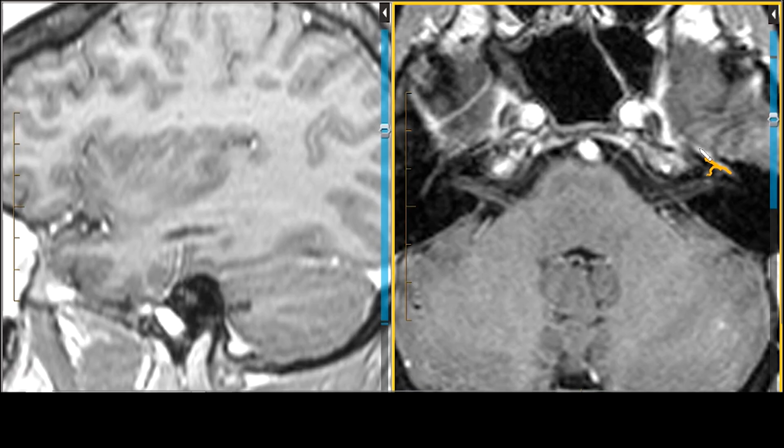Now there's some high signal here because there's a petrosal plexus of slow-flowing vessels right there that contribute to that apparent hyperintensity. The greater petrosal nerve provides parasympathetic innervation to several glands, including nasal glands, palatine glands, the lacrimal gland, and the pharyngeal gland. It also provides parasympathetic innervation to the sphenoid sinus, the frontal sinus, the maxillary sinus, the ethmoid sinus, and the nasal cavity. This is an important nerve.